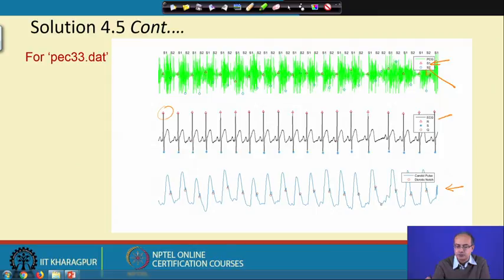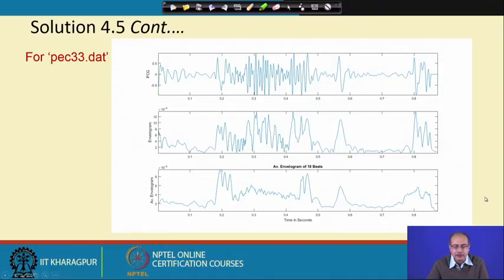From there we got the S2, and you see in this case that in S1 and S2, a lot of murmurs are there, and the signal seems to be merged to some extent. In any case, that way we could find the span of each cycle of the PCG, and from there we could get the envelope. In this case, as the variations are more, S1 and S2 are more jagged, as we can see here. We have the envelope also like that.